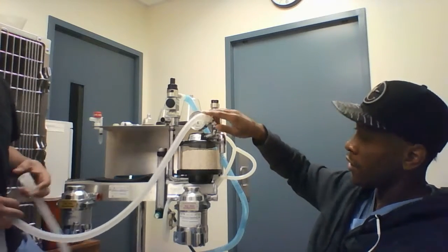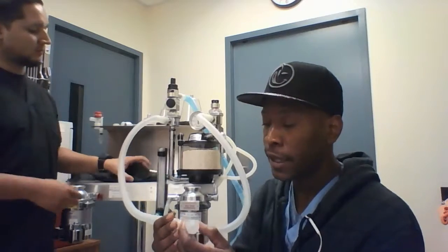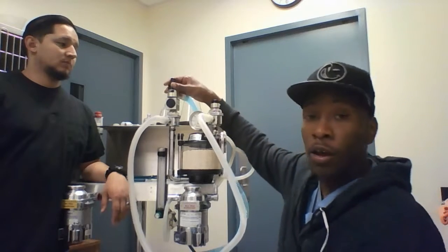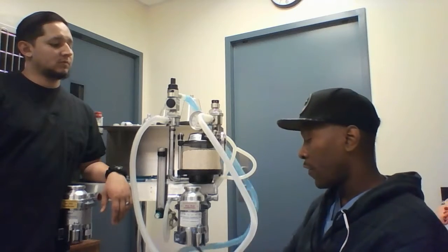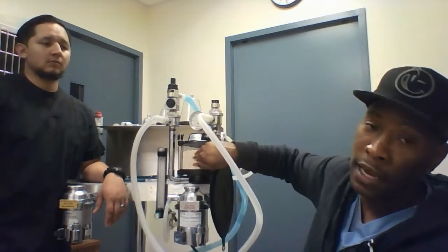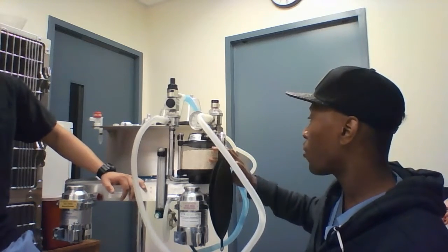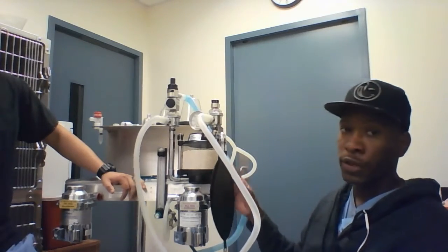Your anesthetic gas and oxygen will travel through the corrugated tubing, through your Y-piece, into your patient. Your patient will exhale, and all anesthetic gas and oxygen will travel down the corrugated tubing into the exhalation valve. All anesthetic gas will bypass the pop-off valve as long as it's open and travel into your F-air canister. And the oxygen, along with carbon dioxide, will travel down the exhalation valve into your carbon dioxide absorbent canister, where the carbon dioxide, or CO2, will be removed, and then all the warm air and regular oxygen will travel back into your reservoir bag, where it can be rebreathed through the circuit into your patient again.